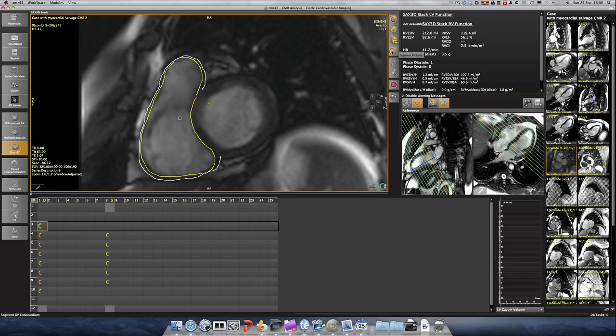And then after that, we'll just look at some basal short axes of different cases, and we decide which ones to include and which not to include. I think that's the really critical part. Whether you draw that contour slightly inwards doesn't make a big difference. Really is, on the whole, is this a basal slice? Is this right atrium or right ventricle? That's where the mistakes are usually made.